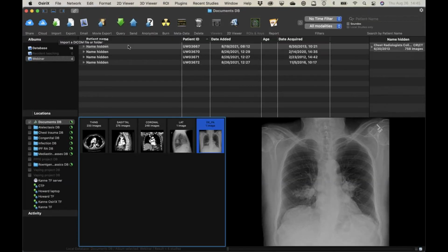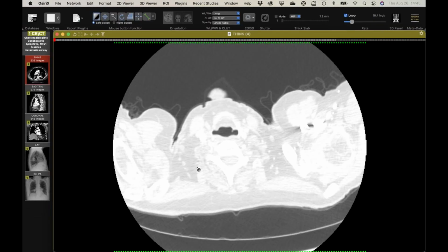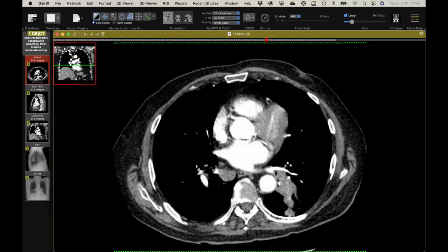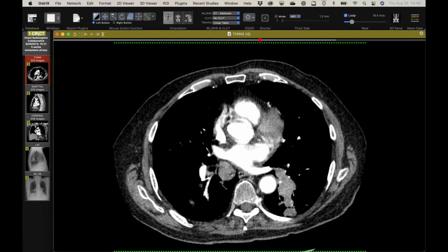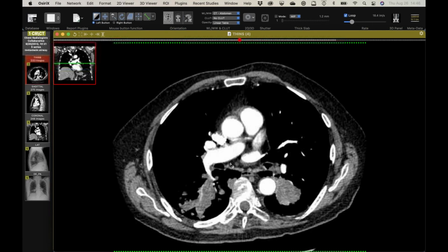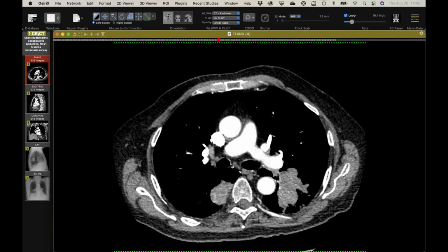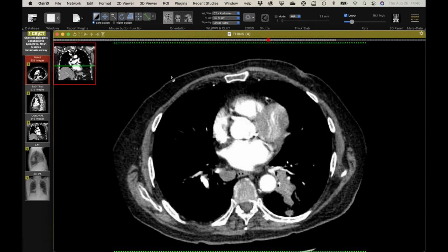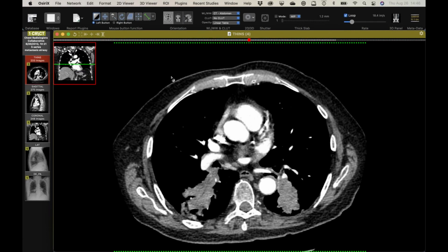Any lymphadenopathy, Jeff? Just the subcarinal lymph node, not a lot. Just this node right here, which may actually be a lung nodule. It's hard to tell because there's a lymph node there. I think it's actually just a lung nodule. So no, it's just airways. I've seen them before, but they're just not that common with colon, other than colon's common, but I haven't seen it. It's just kind of interesting how there's that much lung involvement, but it doesn't go back into the lymphatics. Yeah, I don't have a good explanation for it. Subcarinal.